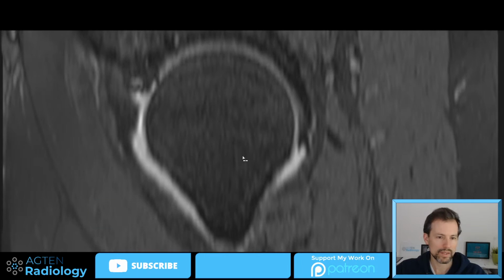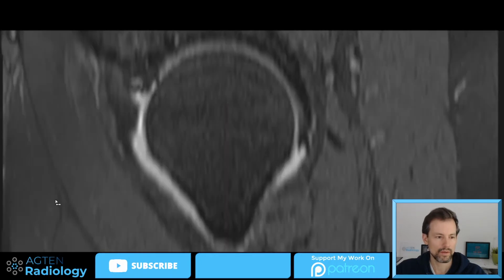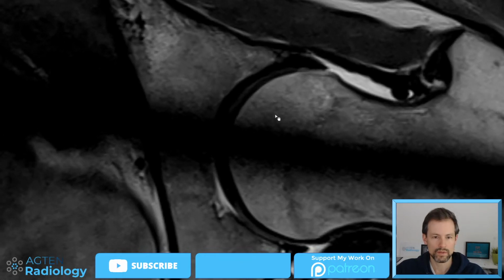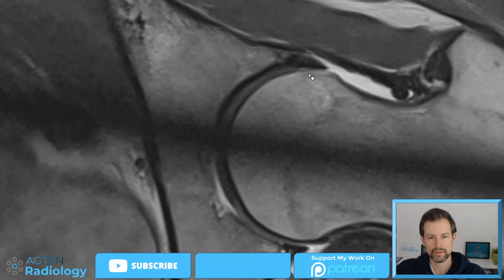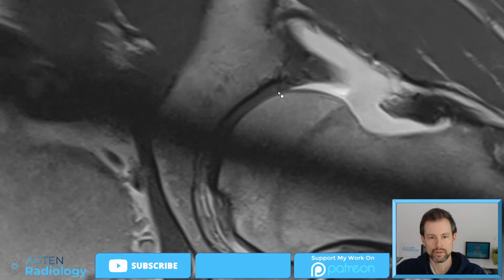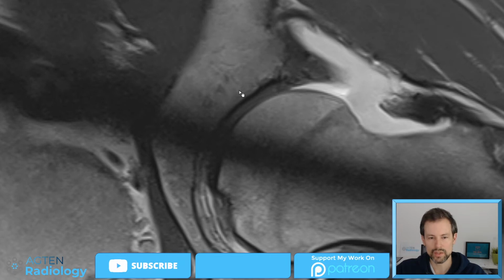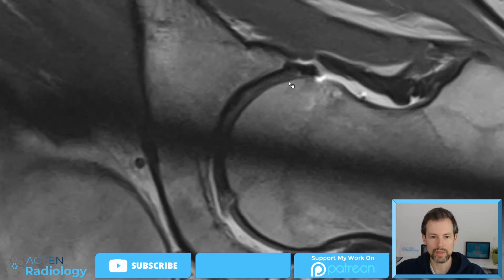Radial imaging obviously can be a good help. It's this one here, not this one, this one. Zoom in. So, okay. Yes. So it's not normal signal. Some alterations might be possible there. It's very subtle. It's not like no major defect.